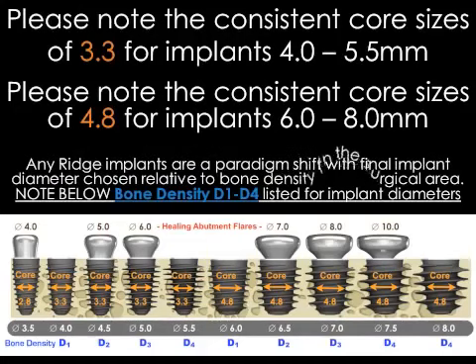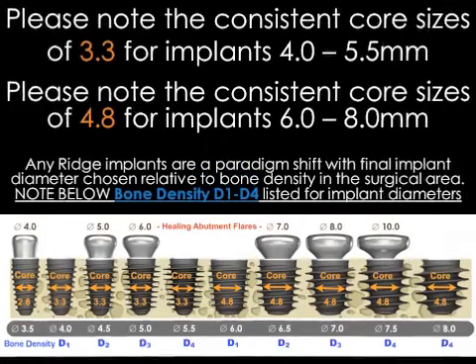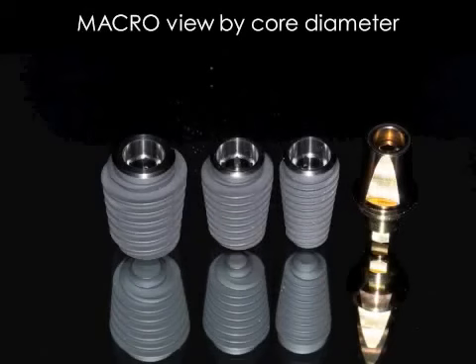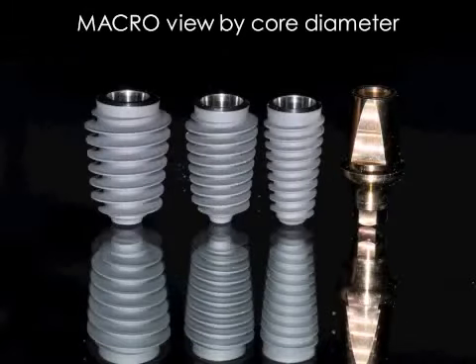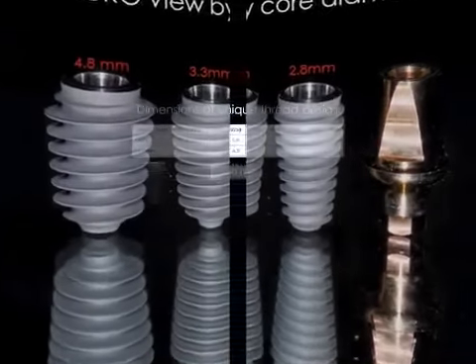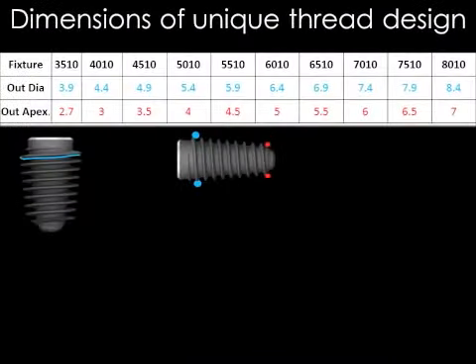Now you can see the different densities of bone. Again, D1, D2, D3, and D4. As the number of the density gets higher, like D4, the thread pattern actually gets wider. So you have D1, D2, D3, and D4 again. But you're really dealing only with 3 core sizes. The 3 core sizes are 2.8, 3.3, and 4.8. Your 3.5 is a 2.8 core, your 4.0 through 5.5 is a 3.3 core, and your 6.0 through 8.0 is your 4.8 core.